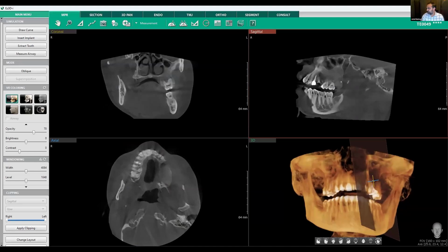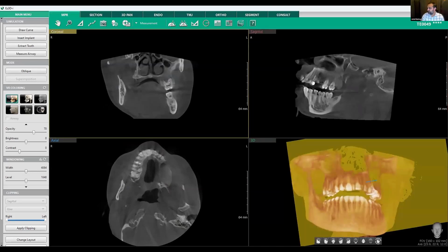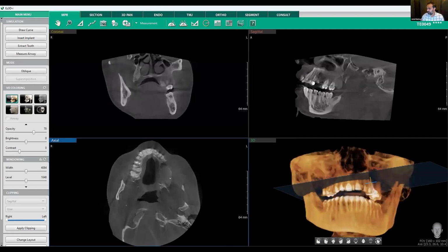And the entity is actually extending from the posterior aspect of the maxillary arch all the way to the periapical regions of the premolars, then extending from the crestal level of the alveolar bone in the left posterior maxilla all the way to the floor of the left maxillary sinus and the floor of the nasal cavity on the left side. And as a result, we can see that there's significant elevation of the left maxillary sinus to the point where it's reduced the maxillary sinus volume.